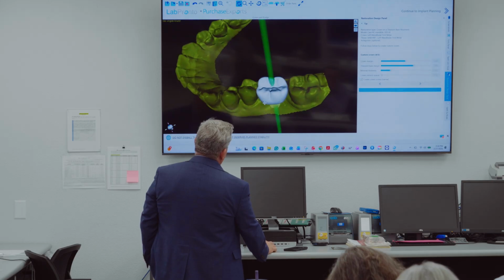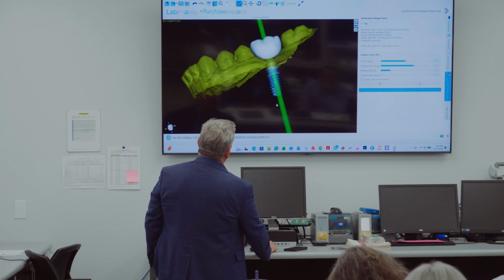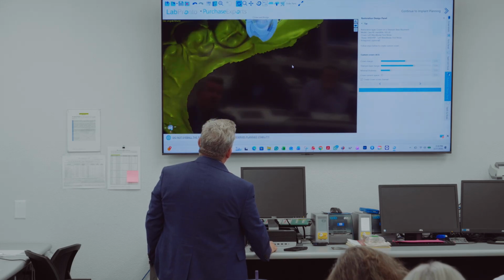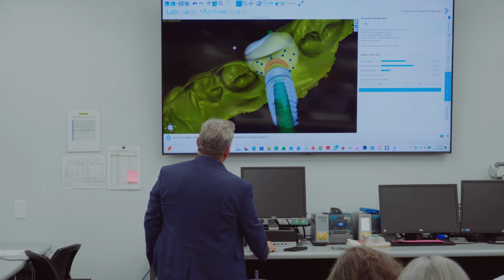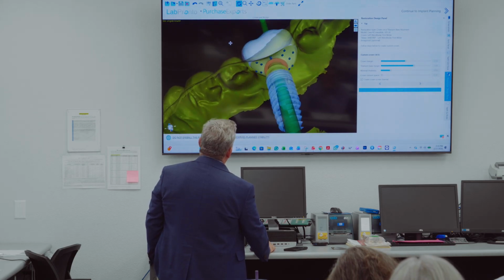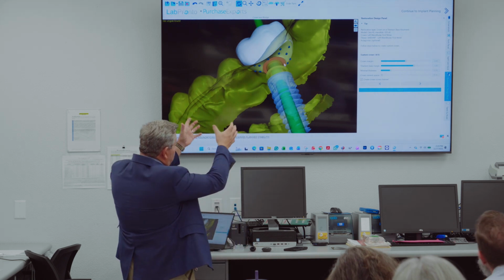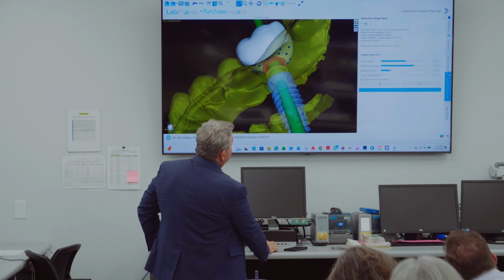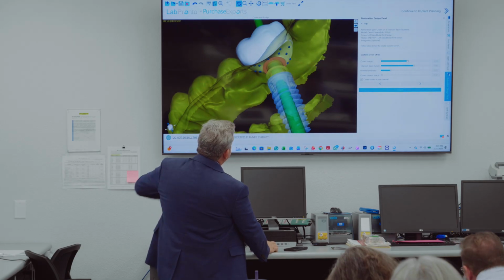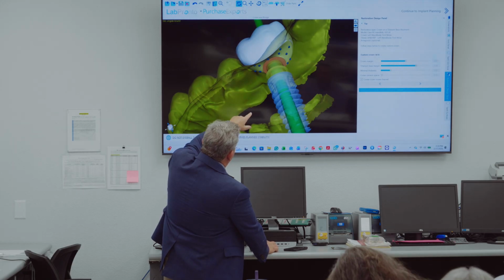And here's where we can make our final changes. If you come over here and look at the crown margin, so if you turn it up underneath here, we've got these little dots here. So now you've got the crown margin. This is harder to see on this one. On the premolar you're going to do next, you can actually see a nice contoured angle. But you've got the crown margin. If you notice here, you see where it's kind of moving up there? That's the actual margin. And then you've got the base contour at the bottom.